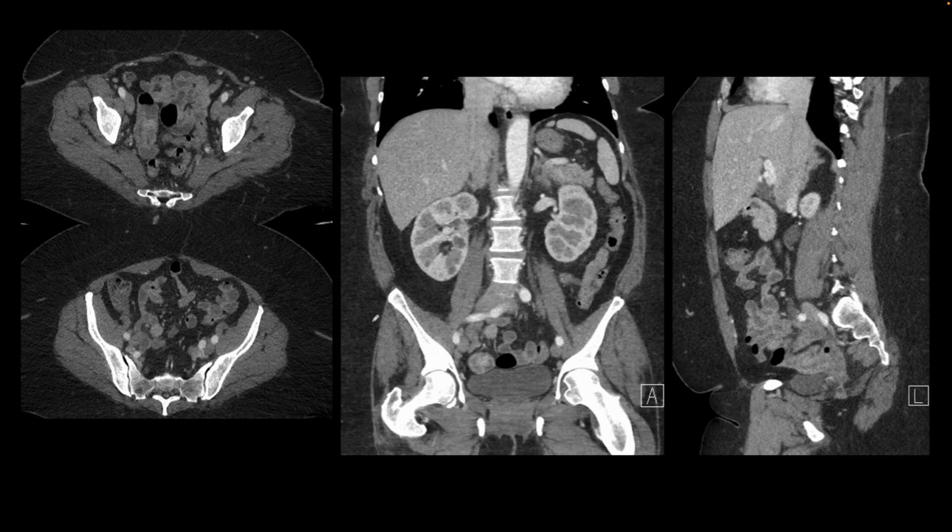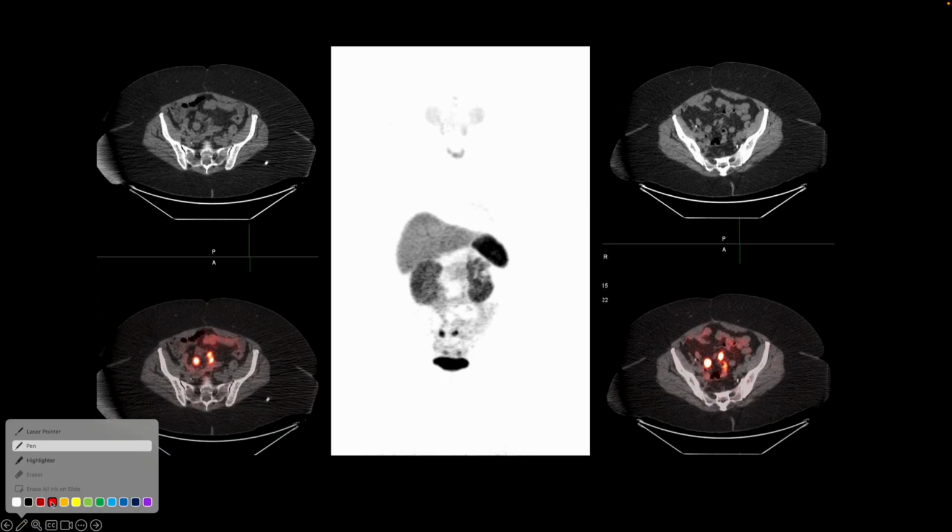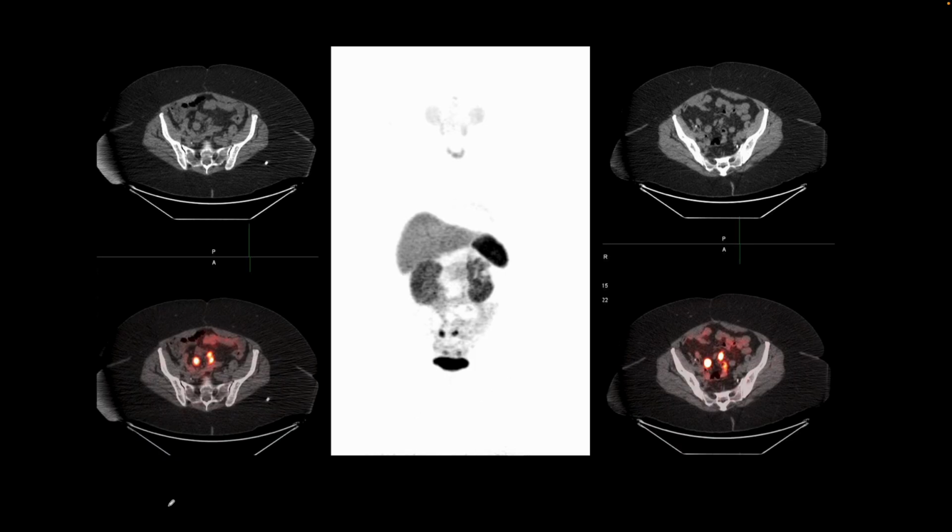This is our next patient. They were diagnosed with neuroendocrine tumor, and the primary was removed surgically, and they presented for a follow-up. The findings are very hard to see on this contrast enhanced CT, but there are enhancing foci that suggest recurrent disease. And so the point of this case is to appreciate the contrast that we see on a dotatate PET CT in these patients compared to a contrast enhanced CT.